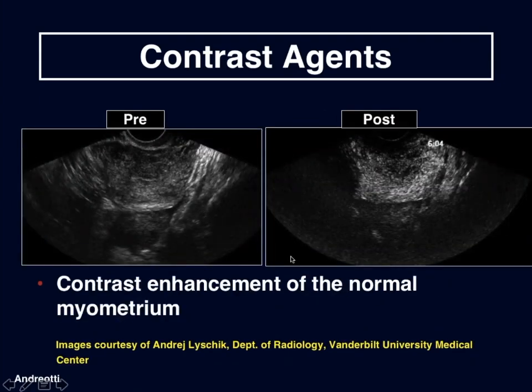And also I just wanted to mention that there can be contrast enhancement of the normal myometrium. So here we can see the uterus without contrast, and then the increased echogenicity within the myometrium after the contrast is administered.